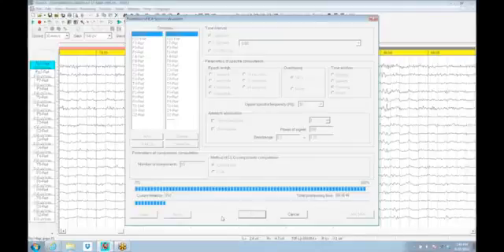We'll be able to see them as isolated components, and we can find their generators with Loreta and all sorts of higher-level analysis. And this is a piece of this freeware that's available. So it's a very high-level computational analysis.